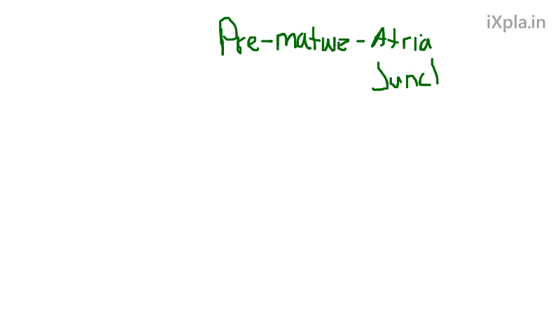You have the two premature beats: the atrial premature and the junctional premature. It just means they occur earlier than you think they would. You would recognize them on EKG because they occur before you expect. She'll give you a rhythm strip and it occurs before you think it should. Atrial means it has a P wave, so a P wave is there. This one means there's no P wave, because it's junctional. Junctional means below the atrium. The AV node is beating.